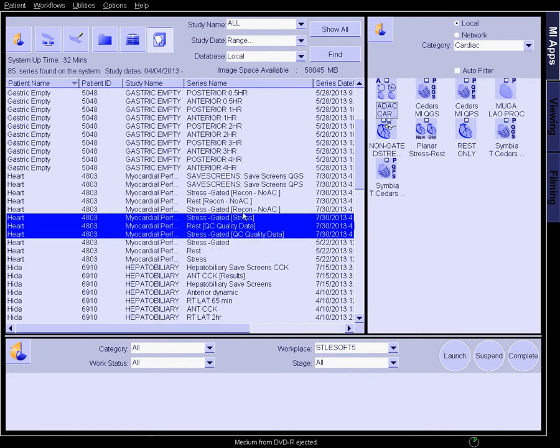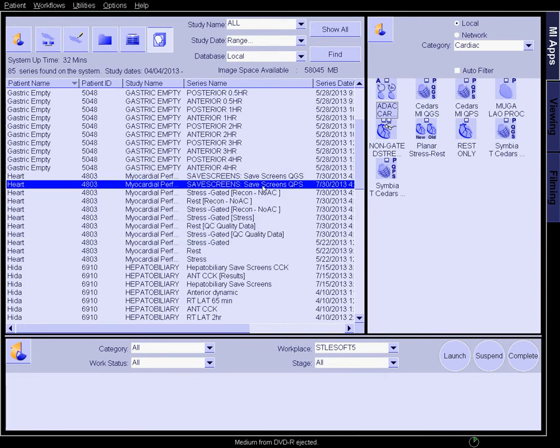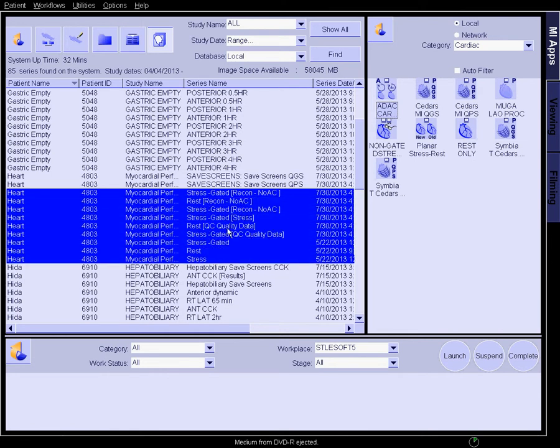Those three files were then reconstructed to these files, and then these files were loaded into these two programs to then generate these two snapshots. The doctors don't even really need to see the snapshots. We're going to transfer them the data that we reconstructed, plus the raw data. Now when we send that data to them, they're going to load it up into their own QGS and QPS tools, and then they'll be able to assess the function of that patient's heart.